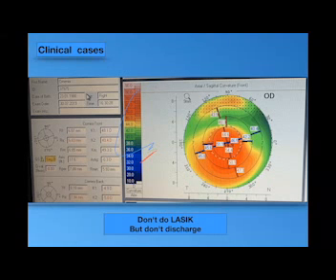Okay, but I think we may find it strange that the astigmatism in this patient is negligible, right? Yes, right. We used to find high astigmatic error in keratoconic corneas. Okay, but if the refraction of this patient is -8 sphere and -9 cylinder on the autorefractometer, and the best corrected visual acuity for this patient was 6/60.